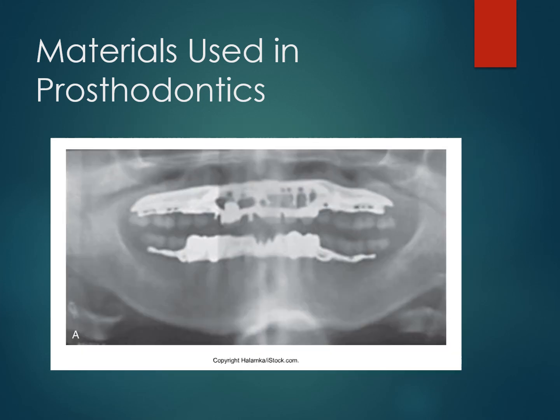This is what it looks like when you don't have your patient take out their partial dentures. So here, this metal frame is what we're looking at, and it sort of wraps around some of these areas. In the back here, you can see there are like these little sort of wings that reach out and hold on. These are the saddles that the book was talking about. And you can see that these teeth don't look like they have roots. In the anterior here, it does look like those patients has roots, and then in the lower as well, it looks like they have some of those teeth. But there's just this metal frame that's completely obscuring our vision of those teeth.